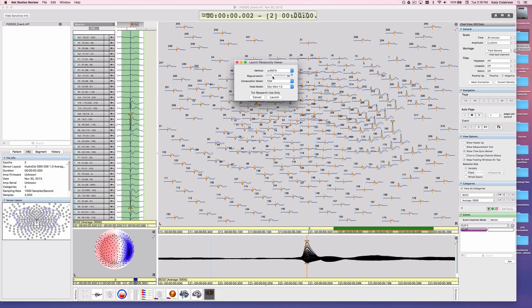Choose your regularization level. Start with values near the provided default. I'm going to keep the selection to -3. This scale uses scientific notation so that 10 to the -1 is more regularization than 10 to the -3. Regularization adds additional smoothing constraints on your results so that you can reduce variance in your data and help the signal-to-noise ratio.